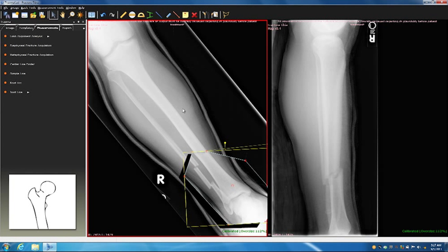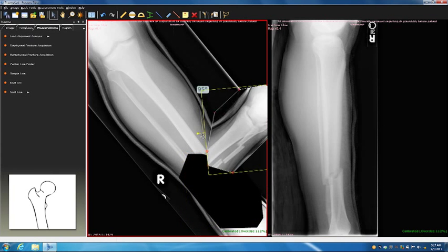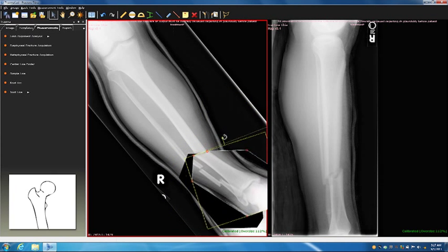I'm happy with that reduction. The orange handle that hangs off the side allows you to rotate. The red circle with the dot in the middle is your hinge, basically your thumbtack. So you can move that to wherever you want, and it'll hinge on different places.